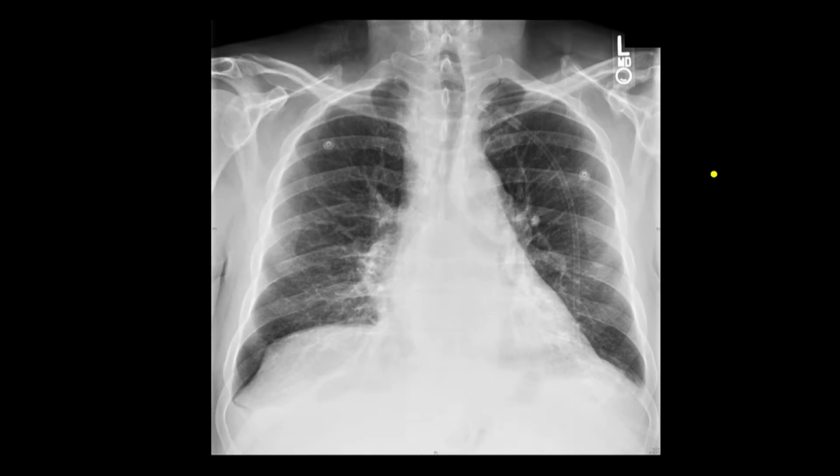So in this patient, again, we're going to start by looking to see if the trachea is midline. And you can see here that the trachea is shifted a little bit over to your left. And you can see that there's increased soft tissue in the right paratracheal region. And so that's concerning for lymph nodes, extra lymph nodes in here.